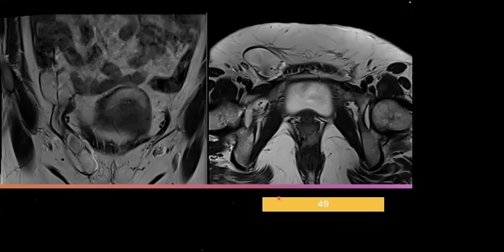So in the fluoroscopic images, one image was of herniagram, if you remember, something related to that. That was a male patient, and here it's male or female.